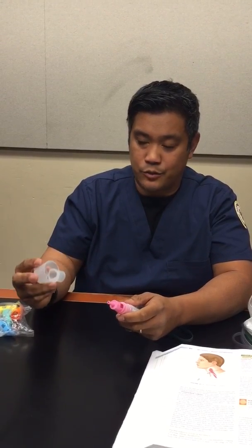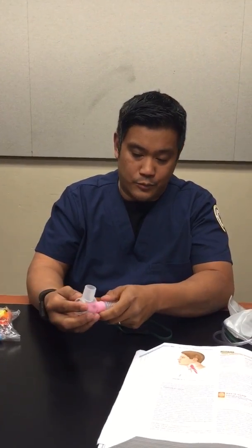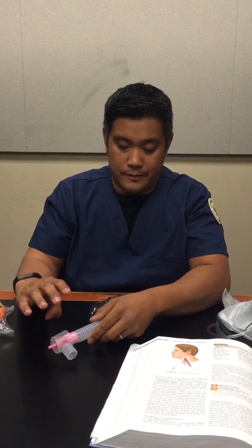To assemble this, you would place this into here, and this would be the aerosol entrainment collar, which you would attach here. This will entrain air and provide the higher flow, and it would also be a protective device preventing blankets and stuff like that from causing the entrainment from being stopped and the patient not getting their FiO2 range.